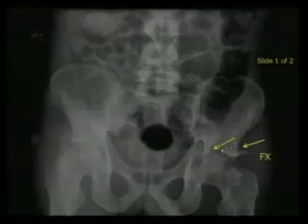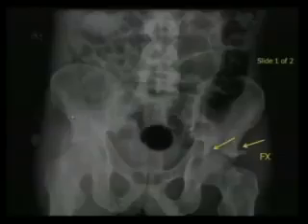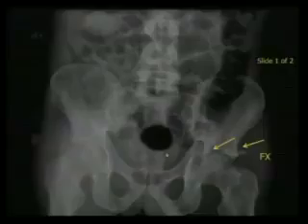This patient has fractures, but that's not why I'm showing you this. What do you think this is right here? Do you think those are vascular calcifications? No, this is a male. Spermatic? No. Vas deferens. And so what might this patient have? Good chance it might have?